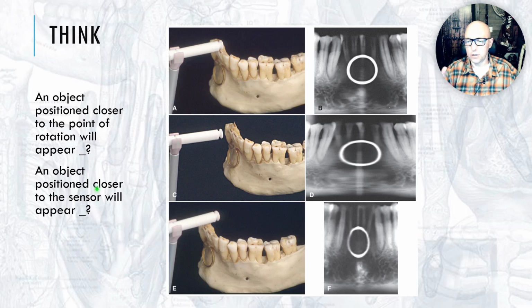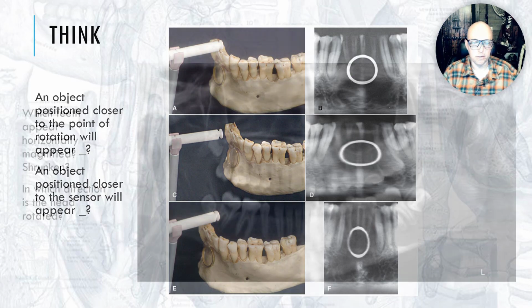Closer to the sensor, I said it's a little bit different than just 2D projection. If you're outside that focal trough, if you're buccal to the focal trough, closer to the sensor, it loses its proportion and gets shrunk down, exaggerated in the horizontal dimension, so it gets shrunk down horizontally more than vertically. And that's the appearance you get right there. Hopefully that made sense. And if that makes sense, you can make sense of when you see images that look like this. Look at the front teeth. That's how you really tell if the patient's positioned properly in the anterior.